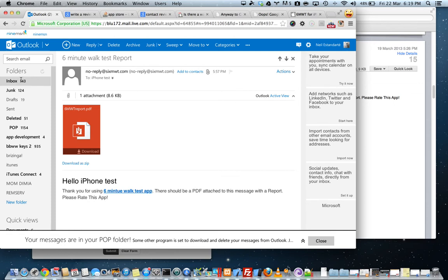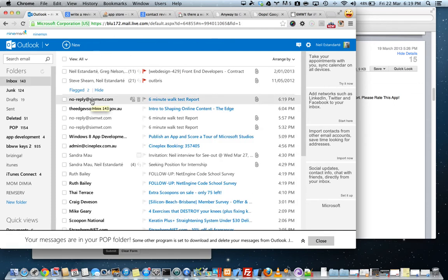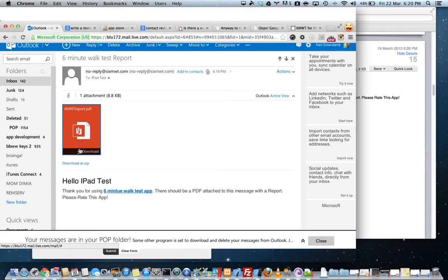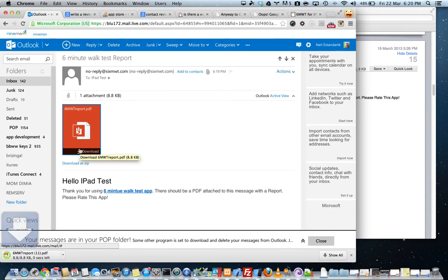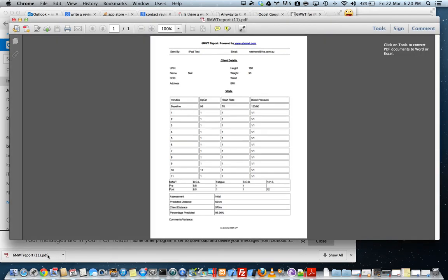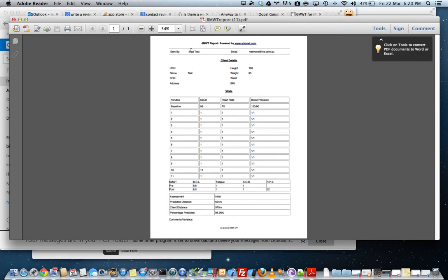So I've been doing a lot of testing this afternoon, and there it is. That's the new email. So that's my 6-minute walk test report. I'm going to download that. Okay, so it's downloading. Alright, let's open it up. Alright, here we go. So as you can see here, it has transferred everything over that I had filled in. So the sent by iPad test, email is anywhere.